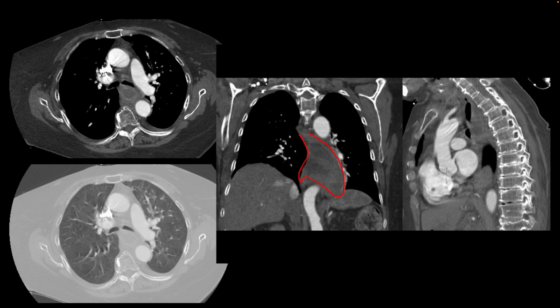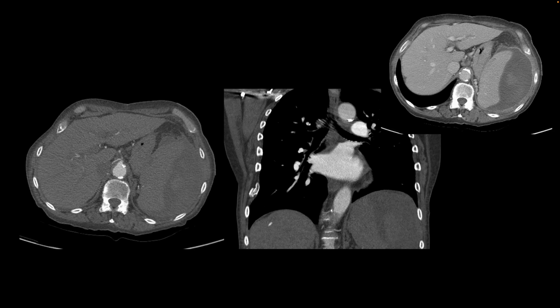We can also see in these patients signs of aspiration and reactive pleural effusions. This is our next patient. Their finding was in the edge of the field of view, seen right here as a large hypodensity in the peripheral aspect of the spleen from a subcapsular hematoma. We see some hyperdensity, which is blood right here.